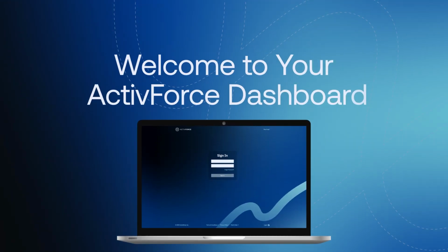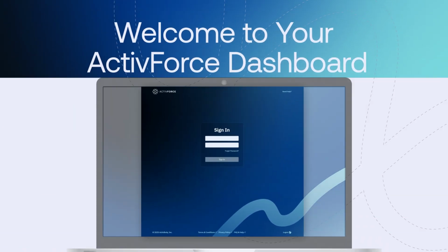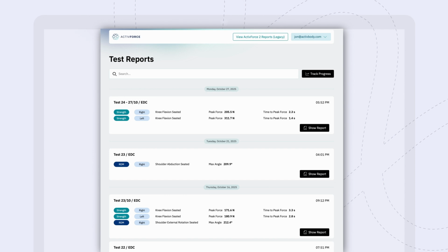Welcome to your ActivForce Dashboard, a complete view of testing history, progress trends, and client reports in one place. This video shows you how to navigate key features and settings.